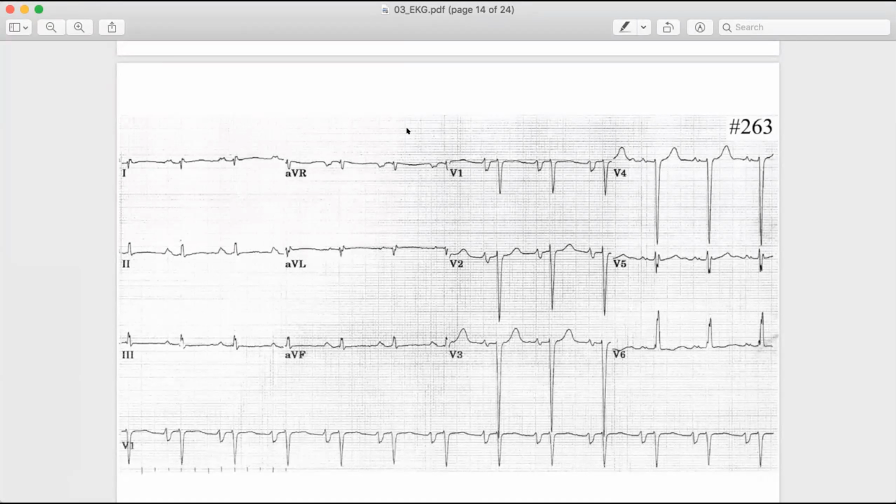Yes, it was hard to tell because all the limb leads had low voltage. That's true, but if you compare the size of 2, 3, and AVF, leads 2 and 3 are about the same. So it has to be around the middle, so around 90 degrees. Yes, 90 degrees. And it's rather rhythmic. We can see the P waves.